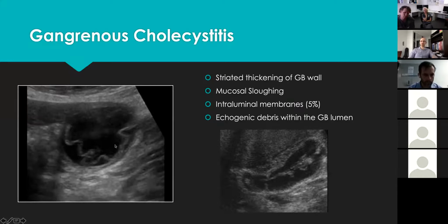Again, for example, this sort of question can come up in the viva a lot. They might put up this kind of image and then say, describe what you can see. They would have some stem on it, say, this many year old patient coming with right upper quadrant pain and tenderness. What do you see? What sort of further images do you want? And what would be the differential diagnosis for it?